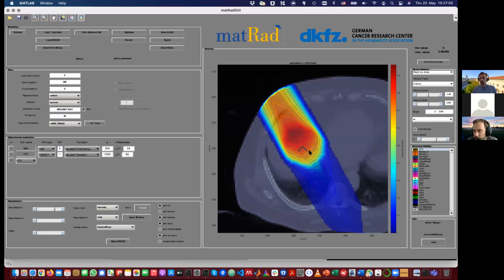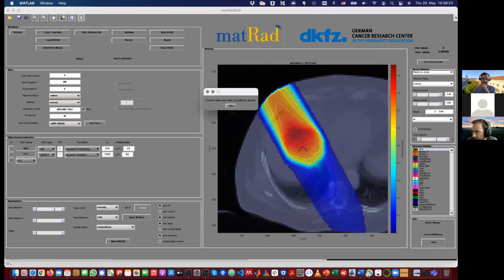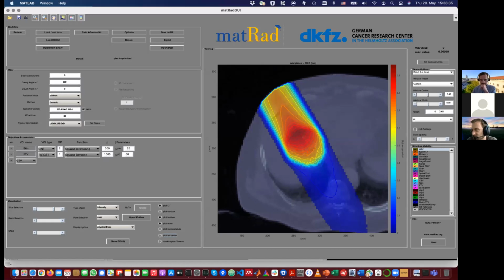So you see, carbon ions are problematic for the computational load. First, you have a denser grid in general. Then you have the tail, which creates additional dose points. Then you have the biological dosimetry, where you need multiple matrices and so on. And if you try a 3 millimeter pixel width and your user interface crashes, then probably your PC is not equipped to handle the 3 millimeters.